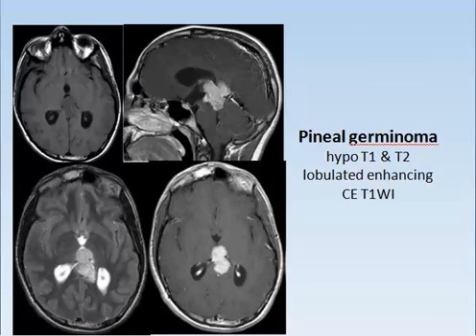Pineal germinoma which is infiltrating due to lobulation, extending forward into the third ventricle, which is converted into a thin slit with associated hydrocephalic changes, and it extends backward here to involve the region of the aqueduct of Sylvius and the adjoining part of the fourth ventricle.